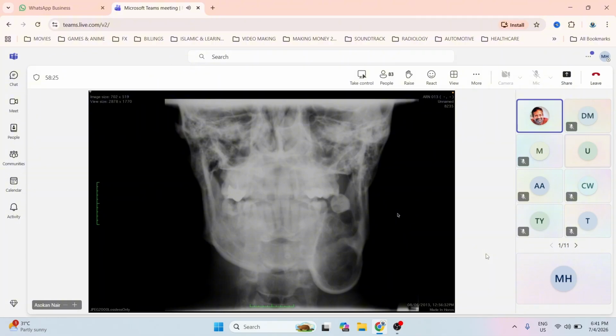If you merge the two, you'll get a subset of a few differential diagnoses, and those will be the ones you'll talk about. Metastasis and myeloma will always fall in this category. Although this looks fairly benign, an expansile lytic lesion, this too comes to mind as well. So you are right, this is ameloblastoma because it's in the mandible and it gives a floating teeth appearance.